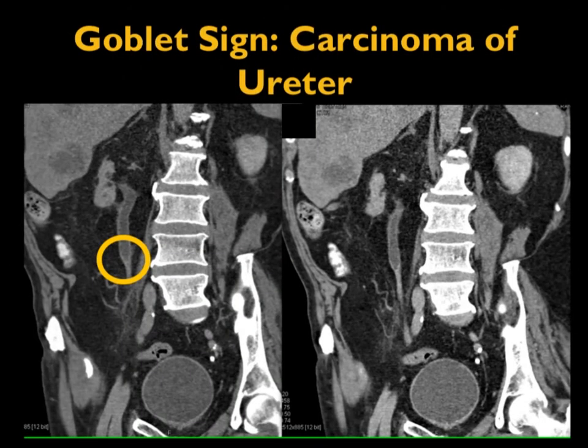Another case. Look at the patient's right hydronephrosis and hydroureter. Whether you wait 5 minutes or 50 minutes, it's not going to be opacified. It's obstructed. Well, when you look at this more carefully, you see the obstructed right kidney, you see the dilated ureter, and then you see a transition point. When you rotate along that transition point, look at this soft tissue infiltration.